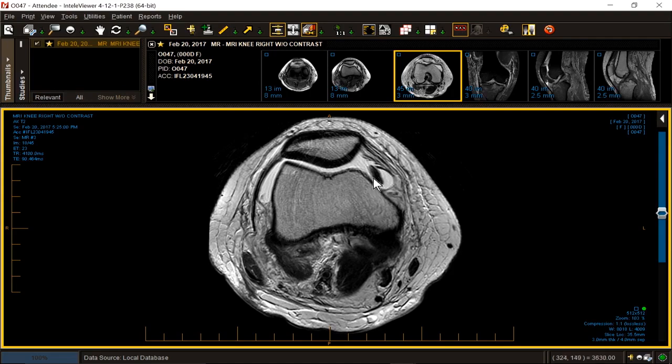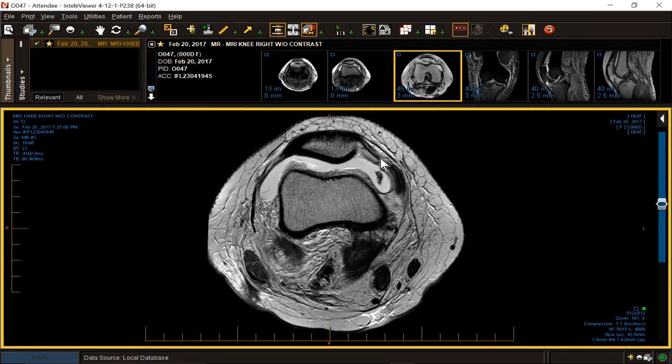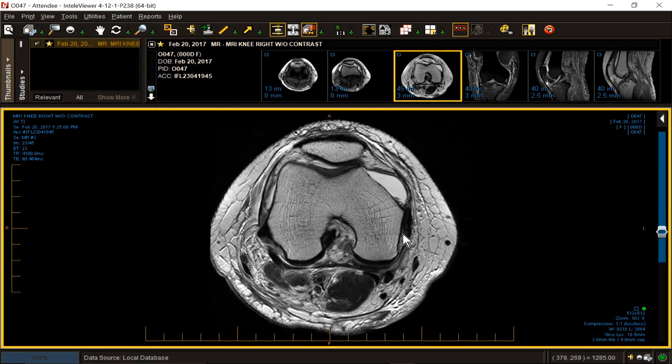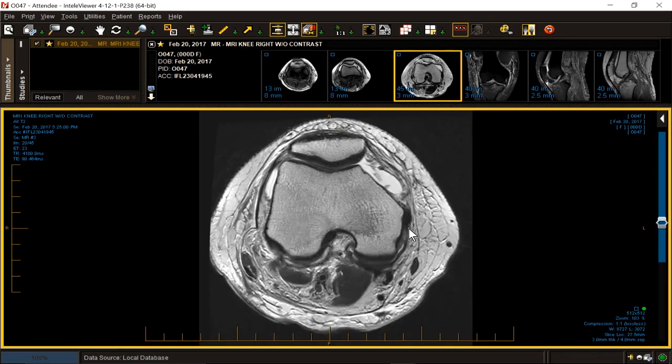There's an object, anterior and medial. Is it blood? Is it cartilage? Is it bone? We don't know, but we better know. The MPFL, a little fibrillated, intact. Our tibial collateral ligament, fat. Now they're all fat, but this one's a little fat and a little gray.